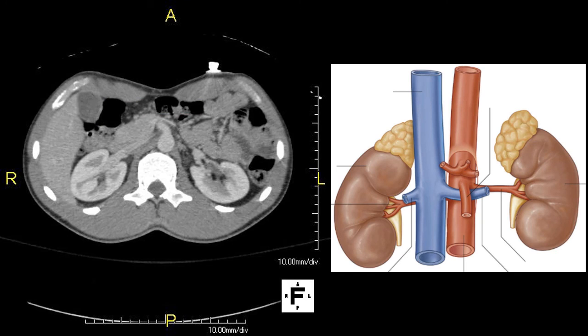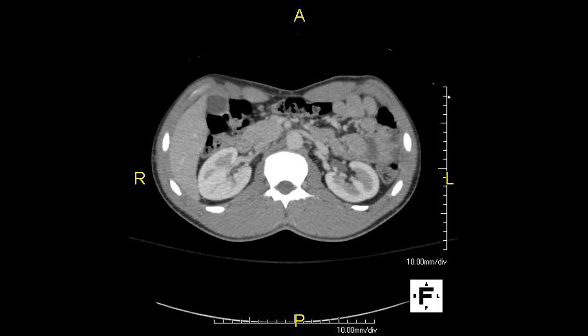Now let me show you where we are with respect to the kidneys with a different picture. So I said, and I'm going to outline this in black, we had the right renal vein. So I'm going to draw a line on our cartoon image right about here. As of this point, I've mentioned everything I want to associated with the major viscera of the abdomen, so I'll scroll through the next few slides relatively fast until I reach the last image of the set, where I just have 1 or 2 more structures to point out for you.